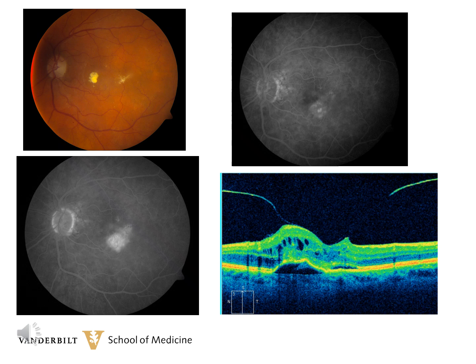And then also many times there is a pigment epithelial detachment, and you can see that on the OCT. And again, that's a triad. There's a pigment epithelial detachment, intraretinal neovascularization, as well as clinically hard exudates and a few superficial hemorrhages.